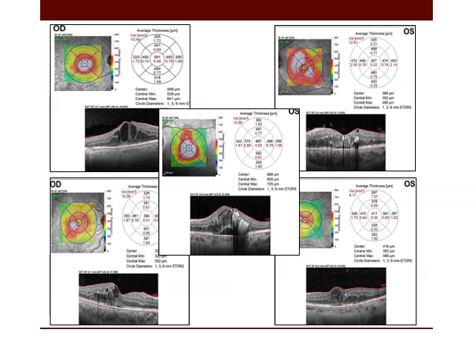These are examples for central involving cystic thickening. Some of them are showing no elevation of the central macula, others showing central serous retinal elevation, tiny elevation in this case.